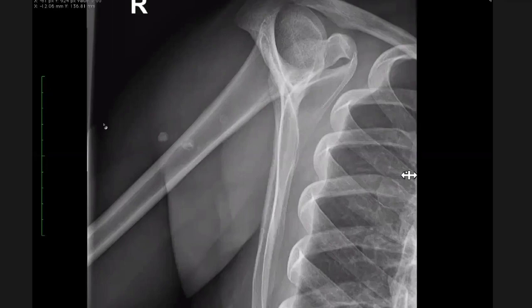Right. Okay. So, what's your differential diagnosis then? Maybe post-traumatic small hematomas calcified, or lipomas calcified. Have you ever seen these kinds of calcifications in lipomas?